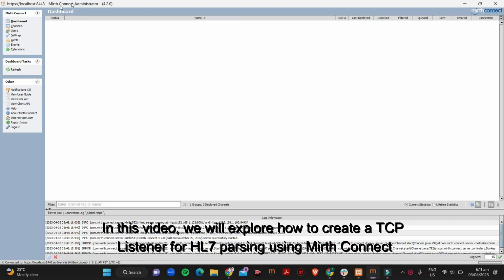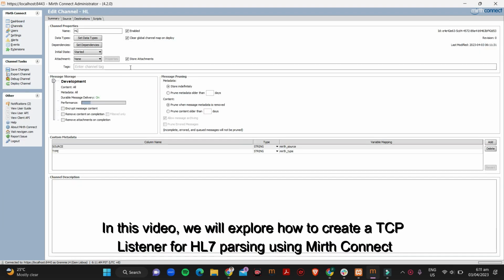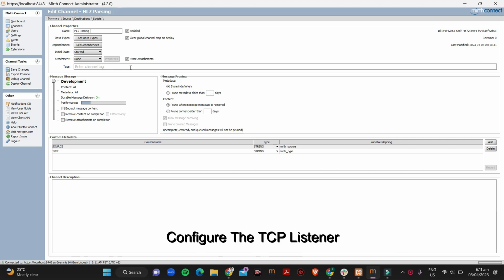In this video, we will explore how to create a TCP listener for HL7 parsing using Mirth Connect. Install Mirth Connect and create a new channel. Configure the TCP listener.